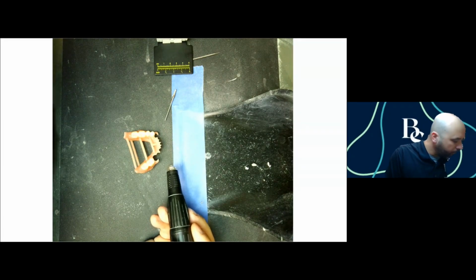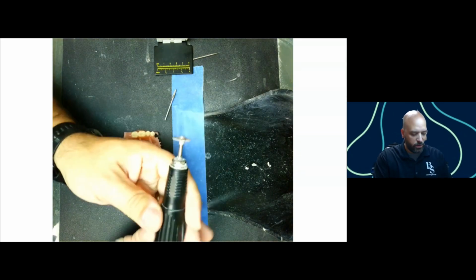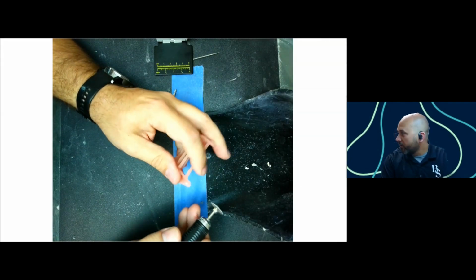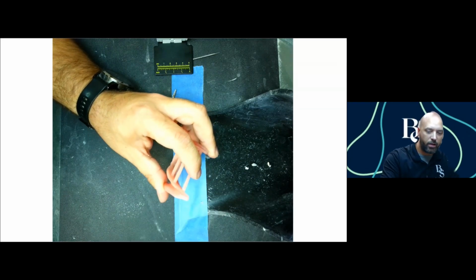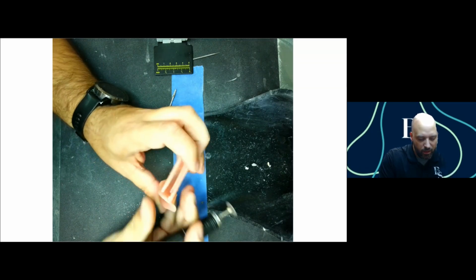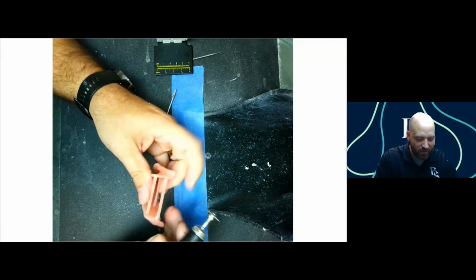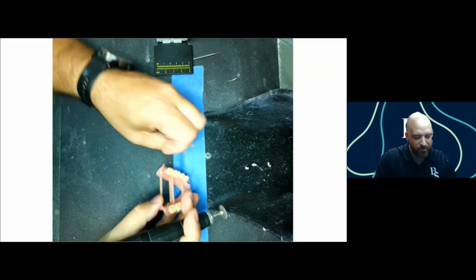So I like to use a smaller disc, something about like this with a little thickness to it. And then I always put a finger over the backside so that if this thing catches, it won't fling it towards me. And then you have to be real careful too, because once this gets about 3/4 of the way down, it's going to want to catch on you and start flinging the disc around. So just be careful of that.